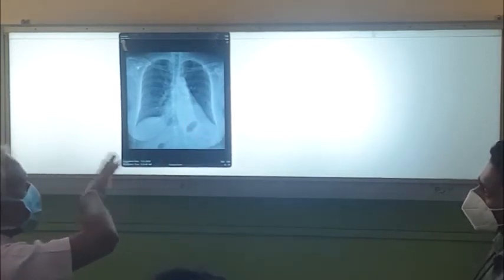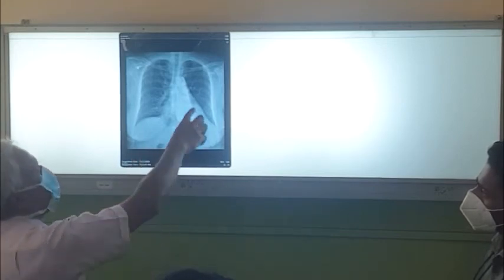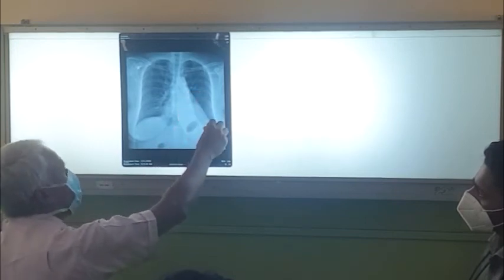This is an asthmatic patient who came with difficulty in breathing, and this is the X-ray. Asthmatic patients can have mucus plugs obstructing the bronchi. So we did bronchoscopy, and this disappears after that. Okay. So this is called the sail sign.